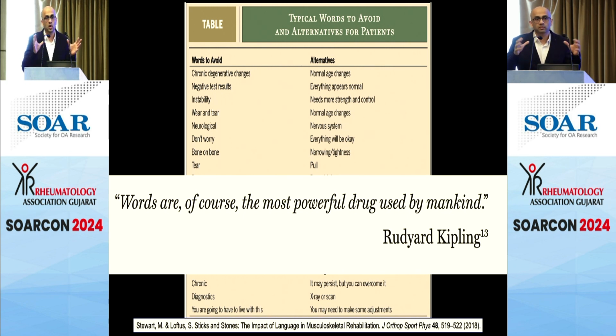So this is what 99% of your patients with MRIs will be. There are going to be some small percentage of patients who have acute radicular pain syndrome or neurogenic claudication, and they have neural stenosis and all. Those guys you can send to me.